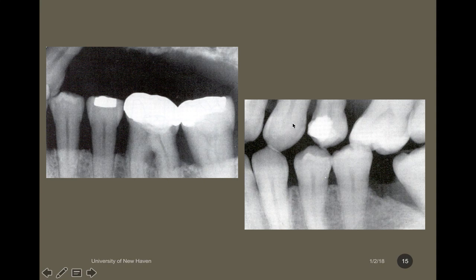However, why am I not saying anything about the maxilla? Does anyone have any idea as to why I can't really make any decisions about the maxillary bone? Well, we can't make a decision about it because we can't see it. So this was the incorrect type of radiograph to take in order to evaluate this patient.